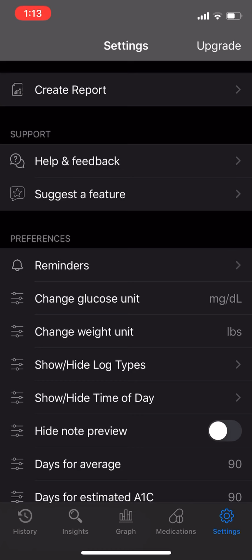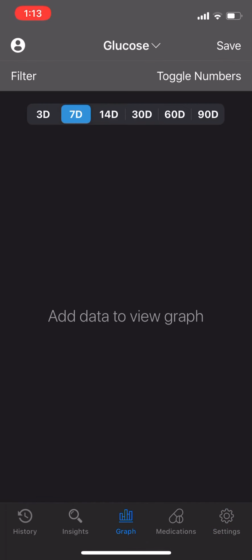Engagement, there wasn't much, really anything to gamify the app, make me engage. I do think the graph is a cool feature, especially with the plus feature where you can have it more than once a week. I feel like that is definitely something that would keep the user coming back. However, you do only get that once a week without the paid version. So I'd say it's different scores depending on the paid version versus non-paid version. But with the paid version, I'll give it a 5 out of 10 for engagement.